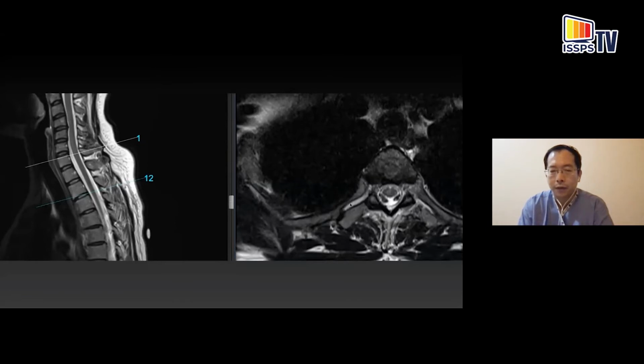Now, be careful. Sometimes you get really big vessels accompanying the intercostal nerves, and you can identify one of them here as well. So this area is a bit dangerous because it's very tight. There's not much working space, and there are lots of big vessels in the region.